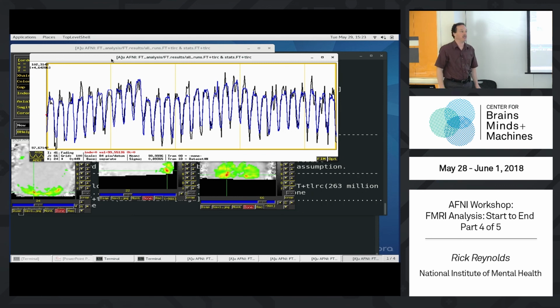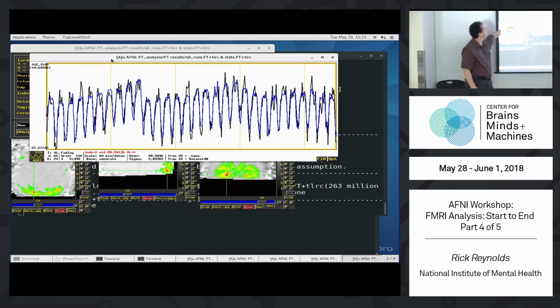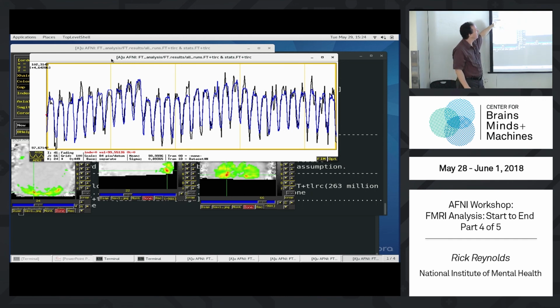So there's our model fit to the data. And how is this created? Again, for run 1, we have some beta weight presumably around 100. There's clearly that the linear drift term clearly looks like a positive number. We have a linear drift up there. The quadratic and cubic terms might be kind of small. It doesn't look like a big cubic effect here. And then the magnitude from going up and down gives you an idea of how big the beta weight should be for your regressors of interest. So the beta weight times each regressor, add these up and you get your data, and that's the fit time series.